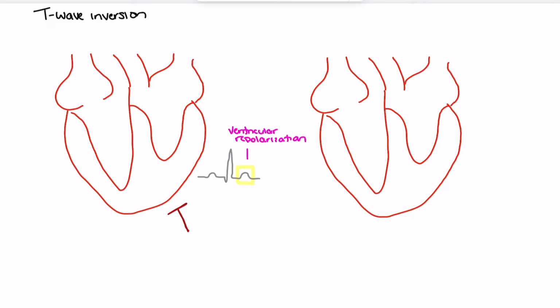What I'll start by outlining is the normal conduction system. In this case, we're looking at normal, non-impaired conduction. We can differentiate between repolarization and depolarization on the ECG based on the flow of electrical current. So we have to have a few baseline pieces of understanding here. We should know that during depolarization, we have the flow of positive current towards our lead.